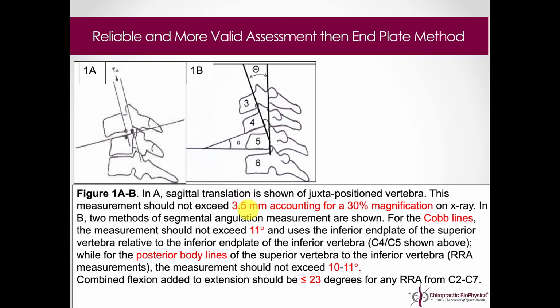So you have that instability report, as well as the quote-unquote instability report, which is the AMA guides method. You can generate either, and then you can generate which you want. What do you want to do? Do you want to do it in the 5th edition or the 6th edition?